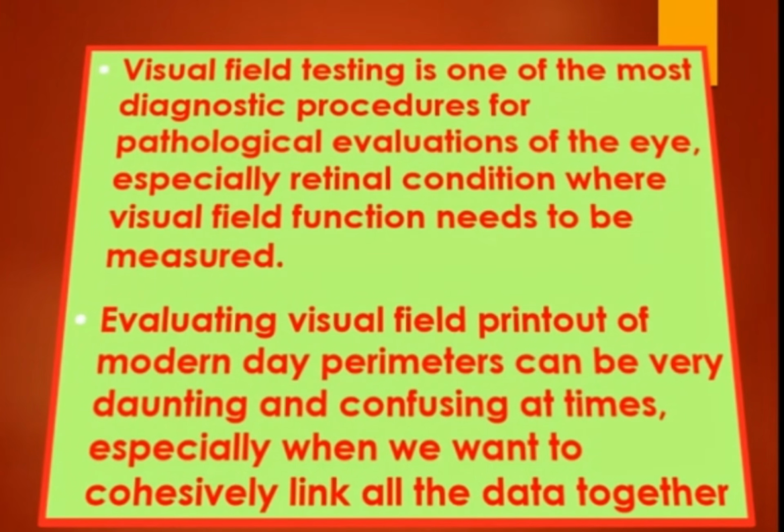So as an optometrist, you should prioritize visual field testing, especially when patients come down with glaucoma, retinopathies, or neurological conditions, and you want to ascertain their level of vision comprehensively beyond the visual acuity testing. So we are going to look at procedures used in evaluating the visual field printout.